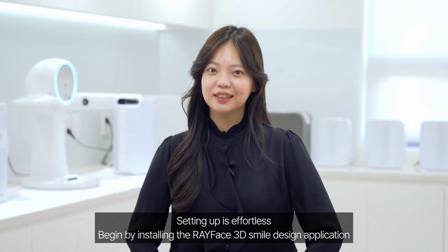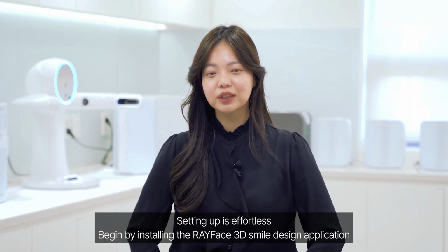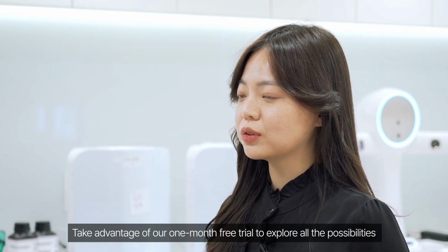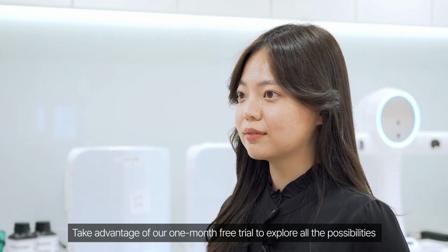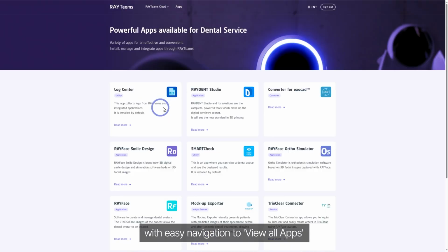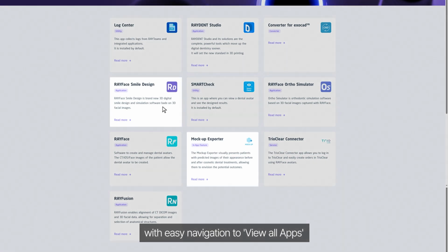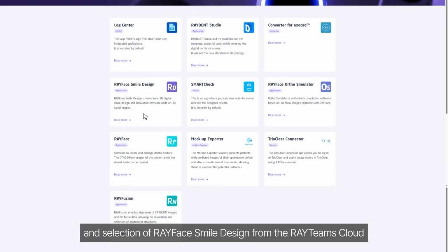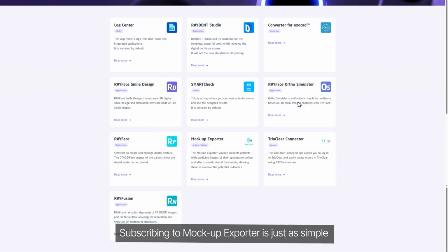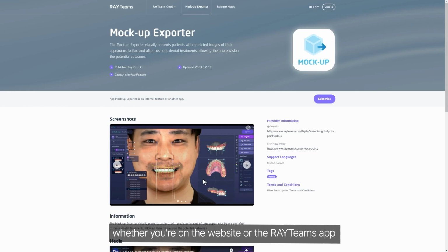Setting up is effortless. Begin by installing the RAYFace 3D Smile Design application. Take advantage of our 1-month free trial to explore all the possibilities. You can start the journey on rayteams.com or through the RAYFace application itself with easy navigation to view all apps and selection of RAYFace Smile Design from the RayTeams Cloud. Subscribing to Mockup Exporter is just as simple, whether you are on the website or the RayTeams app.